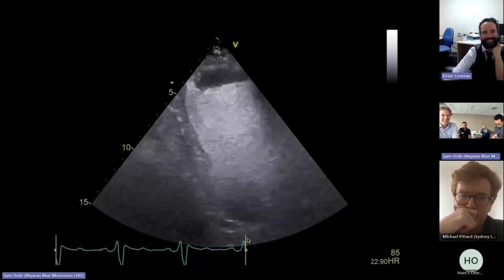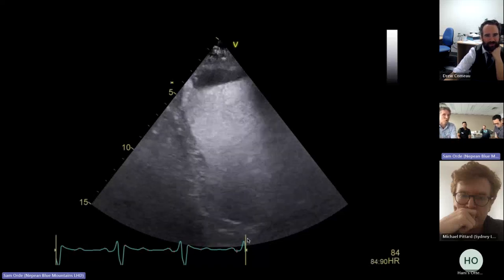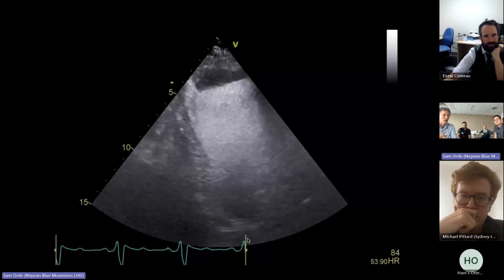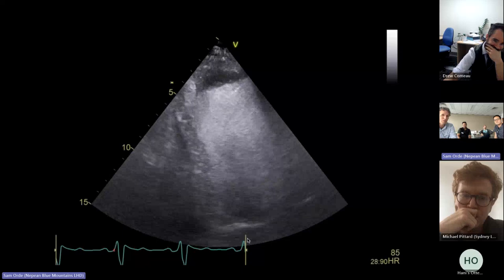Excellent. Me too. And you get this idea, and this would, for me, be an example of someone who's got a chronic thrombus. It's got quite a laminar appearance. It's got quite well defined sharp edges. You wonder if a part of it's been broken off, and that's what caused the basilar artery stroke.